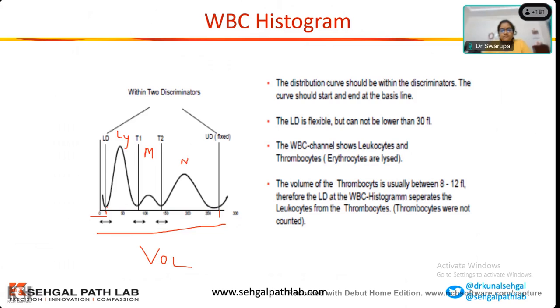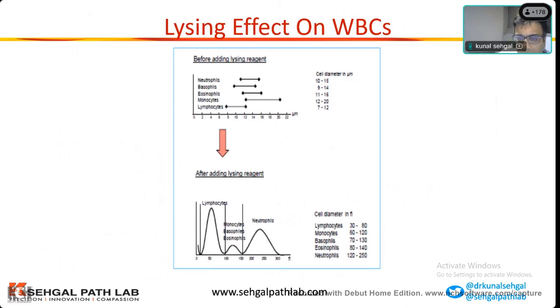Neutrophils. Again, if you see, the curve starts at the baseline, ends at the baseline, starts approximately at the baseline. I'm not saying it is touching, but it's a smooth curve. Okay, it's not as if the curve is starting here and interfering and then forming a population. So that's not happening. Then we go to the next one.